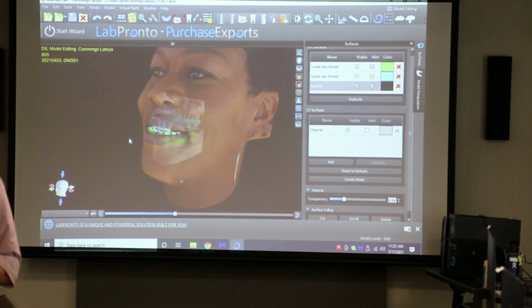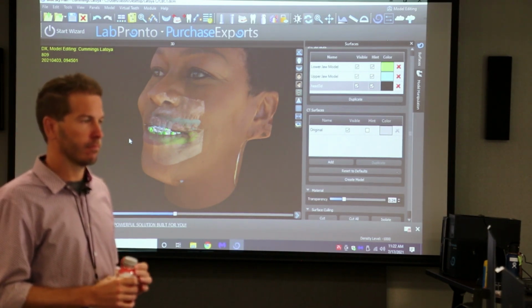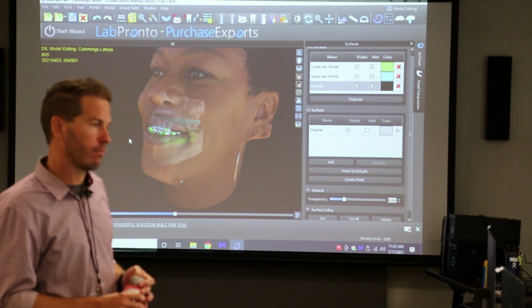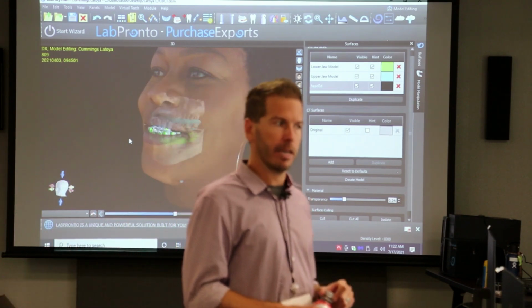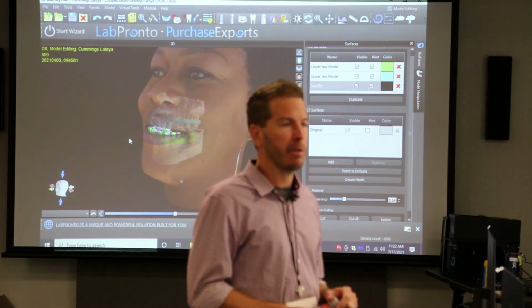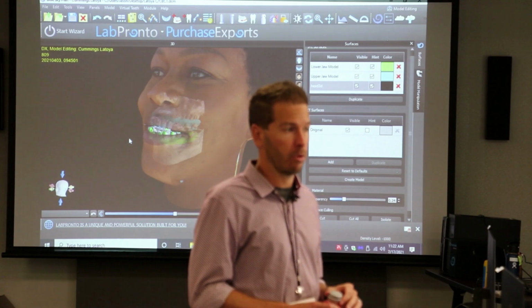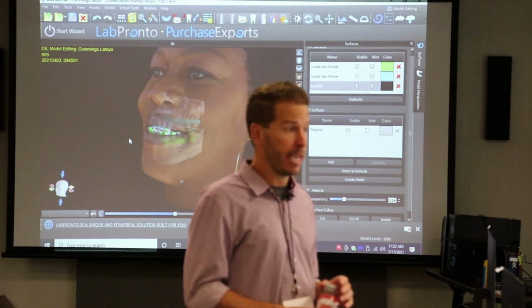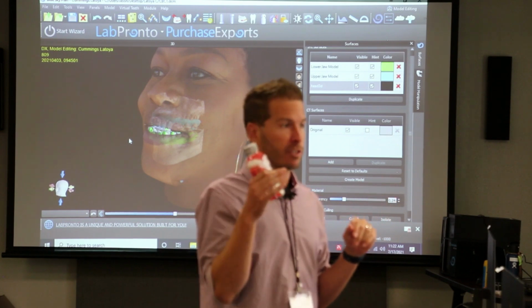I guess the only other thing would be, can you manipulate the scan so that you could show them, oh, here's where you are now, here's where we could get you? Yeah. So that would be where you do that digital wax up, and you import that, before, after.